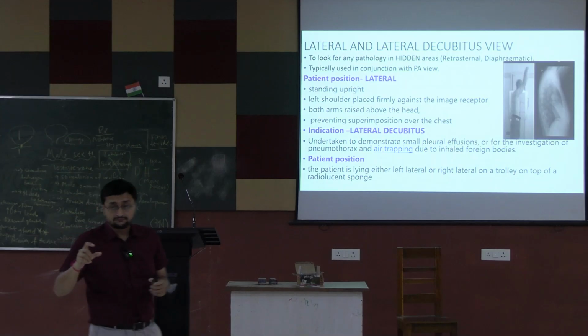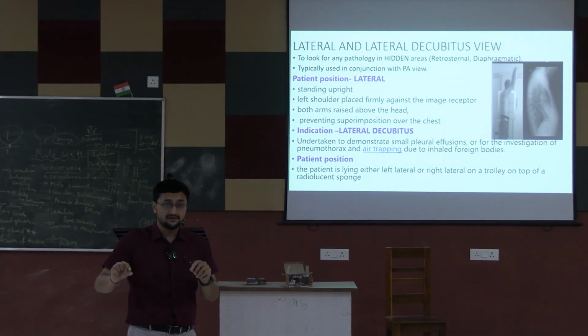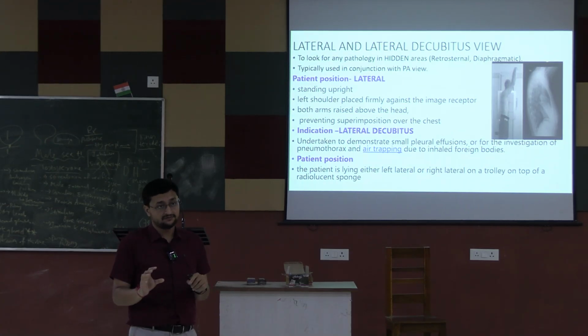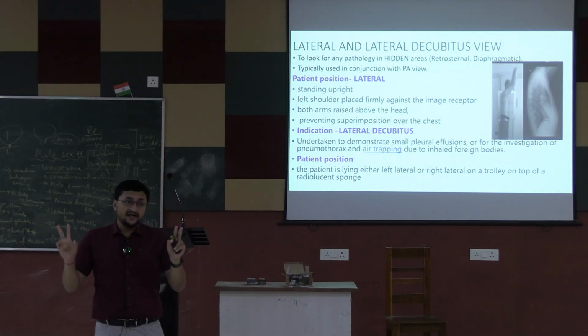the shadow of the bed is visible. The shadow of the bed where the patient is lying down is visible, right? So PA view is the most ideal position, PA view, right?